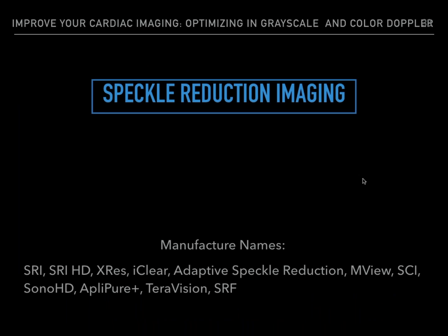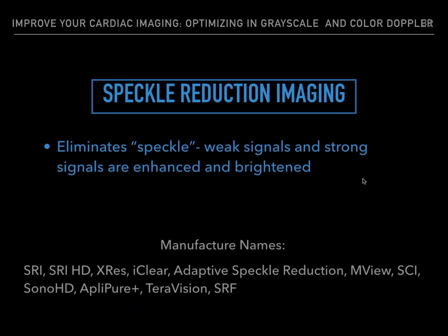Speckle reduction imaging. This eliminates speckle, and weak signals and strong signals are enhanced and brightened. What this does is it actually provides a smoother, cleaner image.